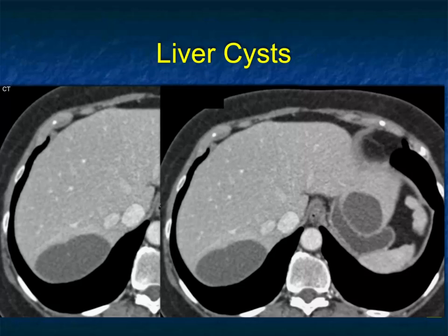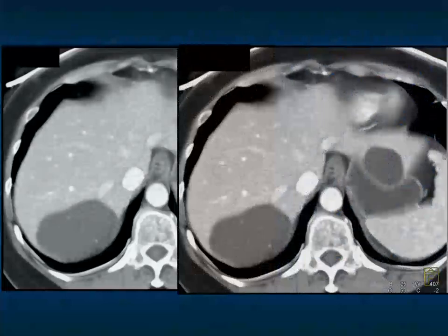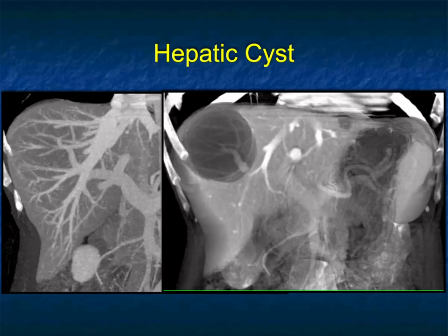A cystic lesion with rim calcification typically is an old hematoma. You can see the density looks very much like the water in the stomach. Occasionally you can see thin septations, but obviously a benign leave-alone lesion. Hepatic cysts typically do not distort vessels, but like anything that gets large enough, and a hepatic cyst can be 20 centimeters, anything when it gets large enough can displace vessels, but does not cause any neovascularity.